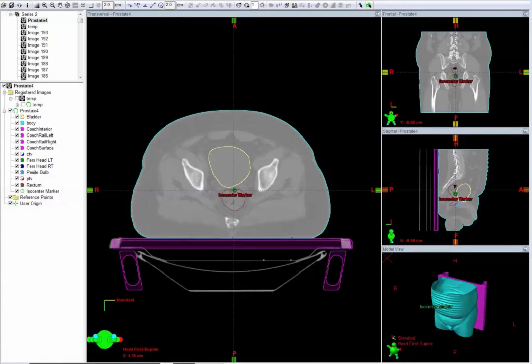This is patient 77774444, prostate fossa alone. I'm going to contour the case of a 73-year-old man who underwent a radical prostatectomy for intermediate risk prostate cancer. At the time of prostatectomy, he was found to have Gleason 4 plus 3 adenocarcinoma involving the gland bilaterally. There was no seminal vesicle involvement, and he had a positive margin at the left posterior lateral prostate.